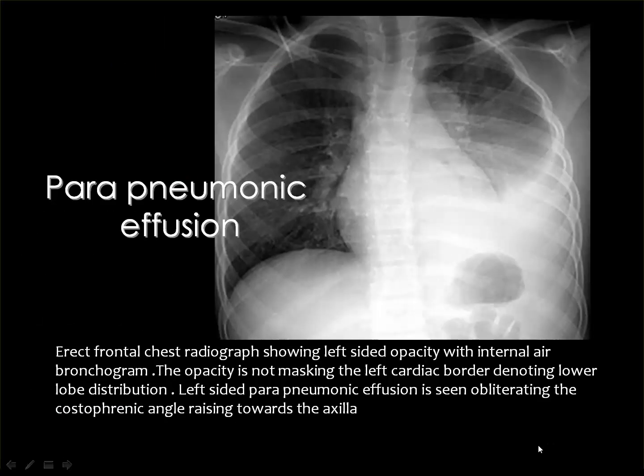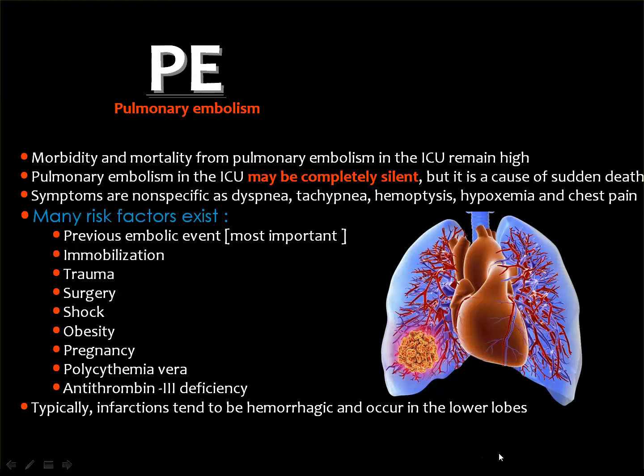And this is a parapneumonic effusion, and you know that pneumonia and infarction may be associated with pleural effusion. This is pneumonia in the left lung, and parapneumonic effusion obliterating the left costophrenic angle.